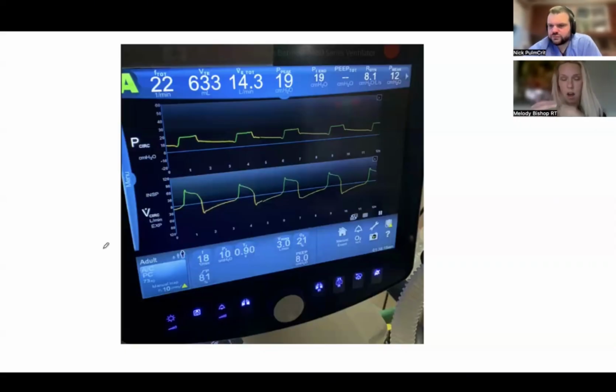And again, that might be newer on this journey. Let's ground ourselves first in what mode of ventilation we're in, and where we're going to look in order to see if our patient might be working too much or too little, or where problems might be. Just to remind people, even if you're not familiar with this ventilator interface, you can see that you are setting a pressure and an inspiratory time. So right away, your brain should be thinking pressure control.